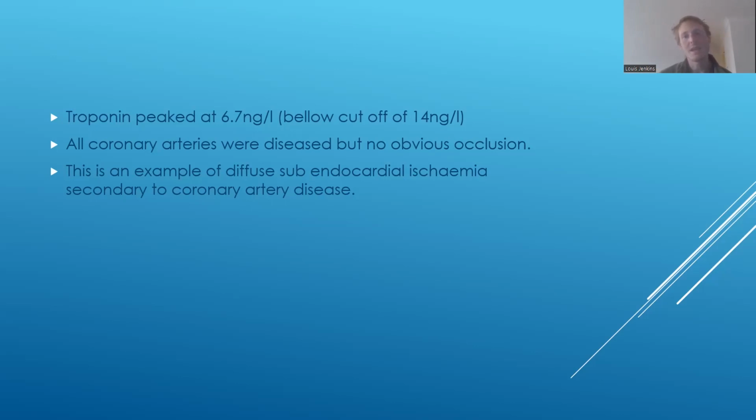This is an example of that ischemia happening. This patient has coronary arteries that aren't occluded. There's not a blockage, but there's disease in them. That means there's not enough blood going to meet the demands of the heart. When you look at the patient's presentation of pulmonary edema, that could be one of the reasons we're getting these changes. There is a problem with this patient's lungs, so she's not able to deliver enough oxygen to her heart to meet the needs of her myocardium. That's causing these changes in her ECG suggestive of ischemia, like ST depression, but she's not infarcting. So this is not a patient who immediately needs a cath lab to save her heart. This is someone who needs correction of her pulmonary edema first and foremost, and then at some point in the future, she might need an angiogram as an outpatient.